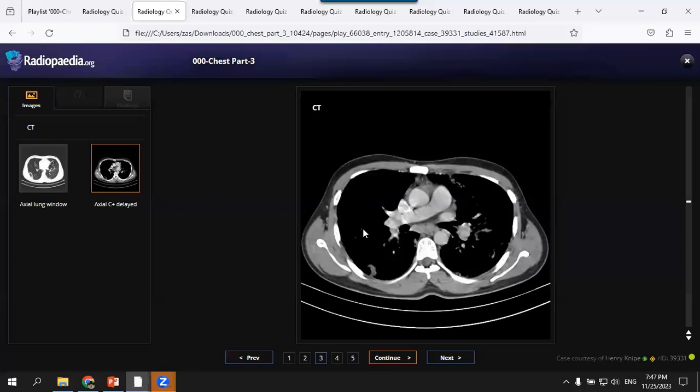window. So in summary, this is a case of cryptogenic organizing pneumonia. I'd like to also mention the other differential diagnoses included. I'd like to compare with the previous images if available, and you can pass my thanks to the referring physician and recommend further follow-up.